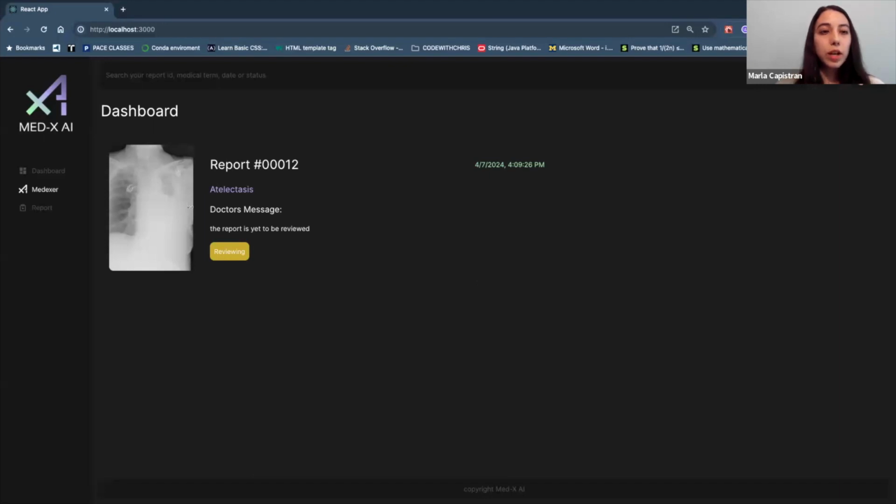This report was given a report ID of 12. Additionally, there is a review status bar showing reviewing, meaning that it must be validated by a doctor. In order for Angela to view her past reports, she can click on either the Report tab or use the search bar. We will be using the search bar.